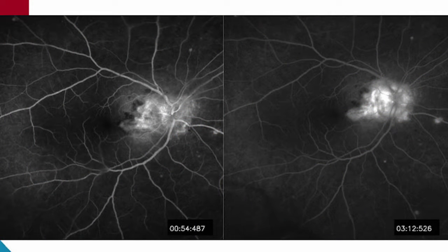Further evaluation revealed hyperfluorescence on fluorescein angiography, which was peripapillary in location. In the late phase, the hyperfluorescence tended to increase, but we did not see any obvious choroidal neovascular membranes. We have also seen blocked fluorescence both in the early and in the late phase, which corresponds to the heme that was observed clinically. I think, Aniruddha, this is a good point to illustrate here.